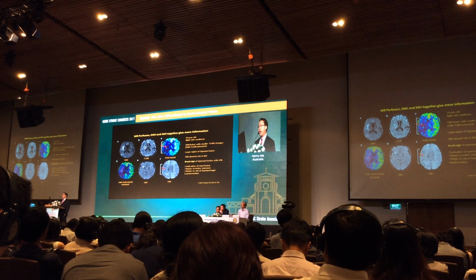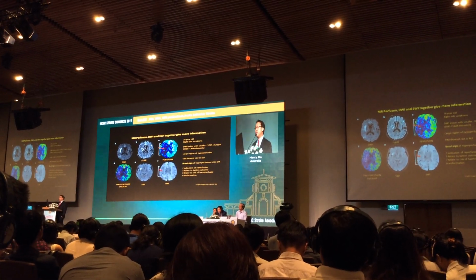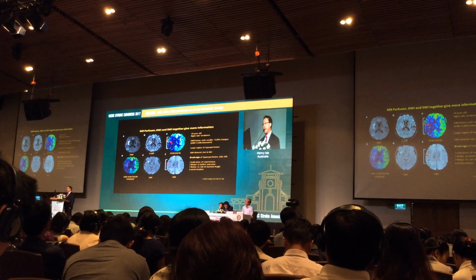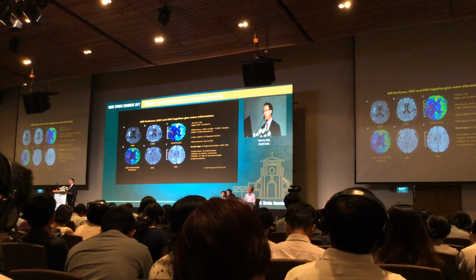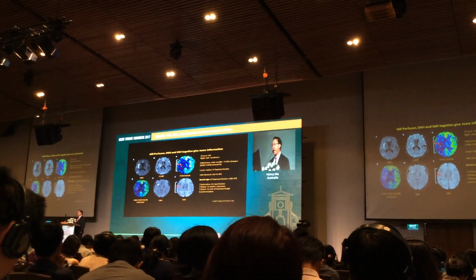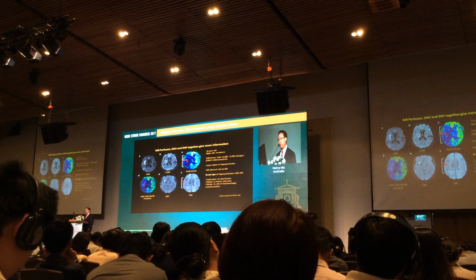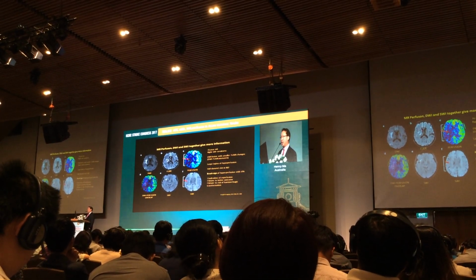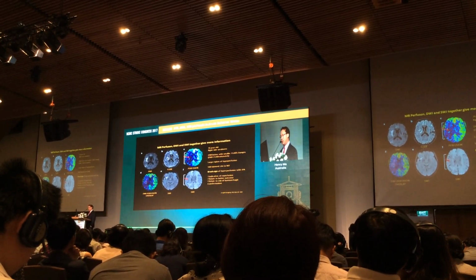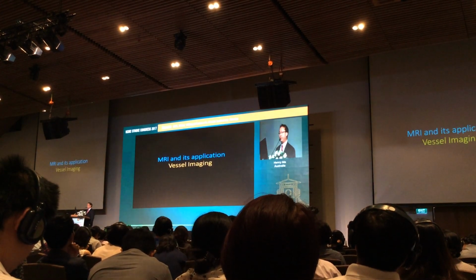This is a case where you can also look at MR perfusion, DWI, and SWI together. This is the same case with the brush sign, where you have acute ischemia in slide A on DWI, with very little change in slide B on FLAIR, but a large perfusion deficit in slide C. And you can see in slide F there is a brush sign, where there is dilatation of collaterals due to the clot in slide E, where you can see the little clot in the vessel. So with the whole sequence, you can actually tell the story by using MRI.